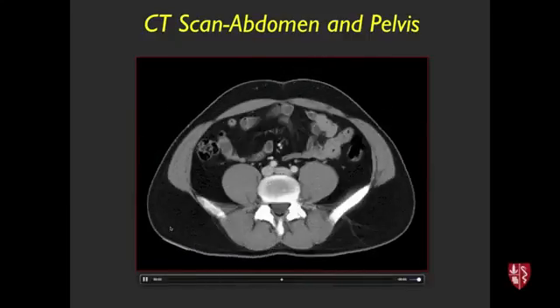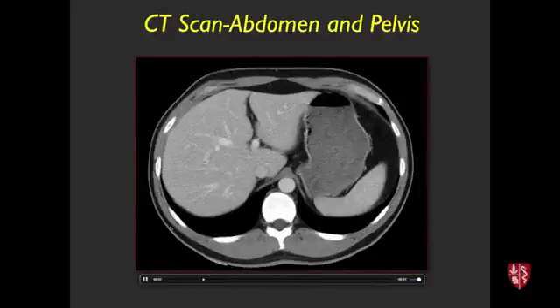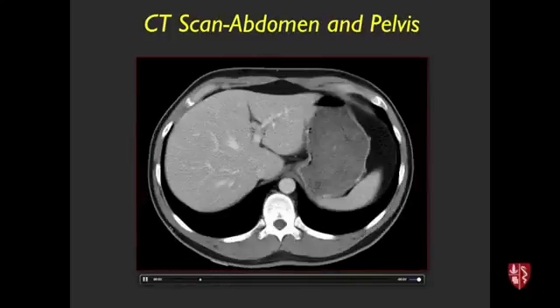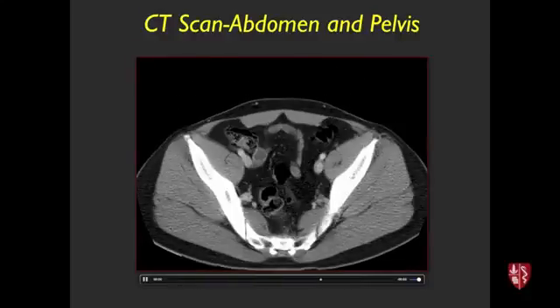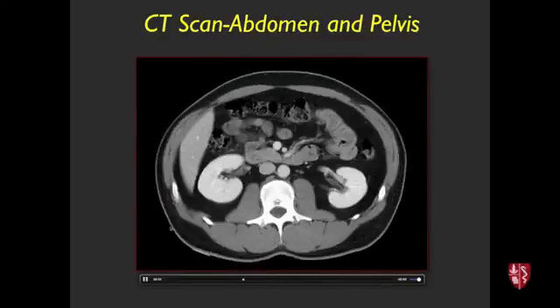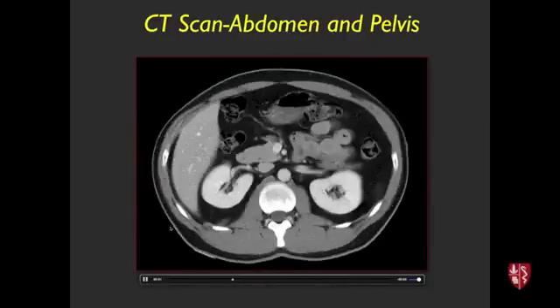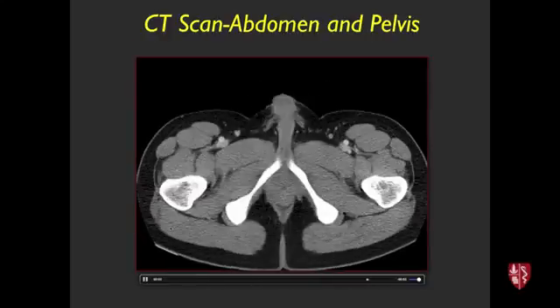This is just scrolling through an abdominal CT, and it's not really the focus of this talk, but as you see it go from the diaphragm all the way through the pelvis, this is approximately the speed at which a CT is now acquired. Back when I trained, it would take about 2 seconds per slice to get a CT image. You'd say, patient, take in a breath and hold it. Breathe. And over and over.